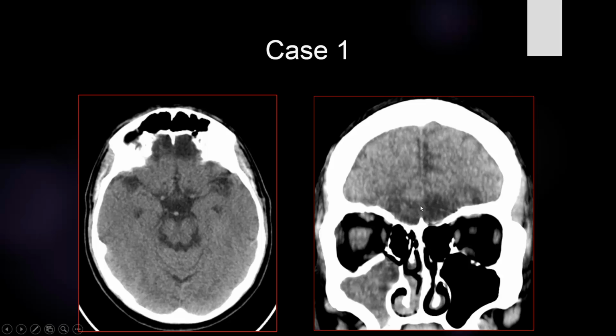In old or chronic cases of brain contusion, we can see the area of contusion transform into an area of CSF encephalomalacia. So there is a bilateral, rather symmetrical area of encephalomalacia involving the typical location for brain contusion. So this is a typical bilateral frontal brain contusion.